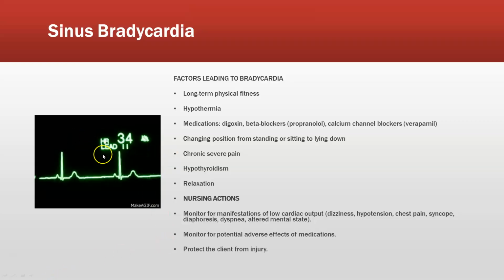And on a monitor, here's what it would look like. Now, there are so many things that could cause a bradycardia. Your first thing is to find out if they're symptomatic, and if they are, then you want to treat the underlying cause. If they're an athlete, I don't care. If they're hypothermic, I do care.